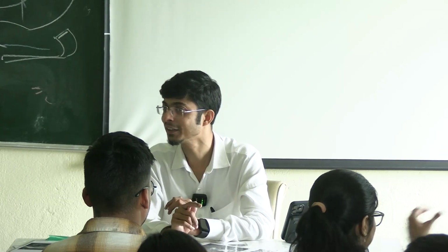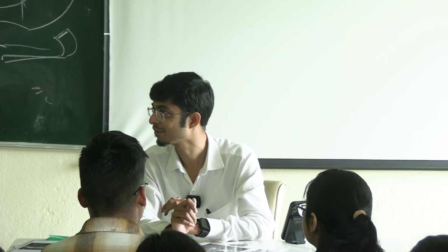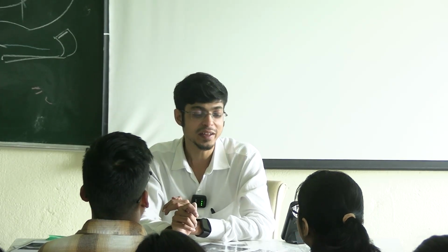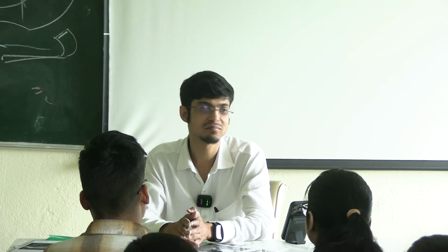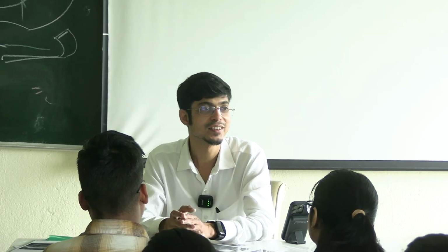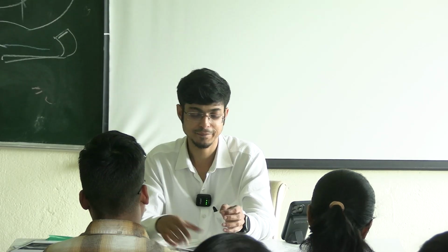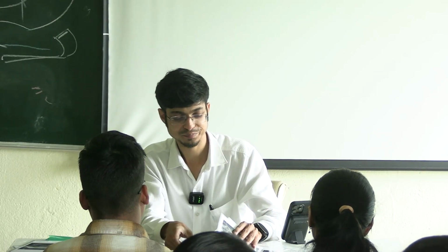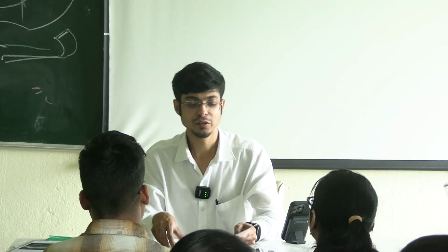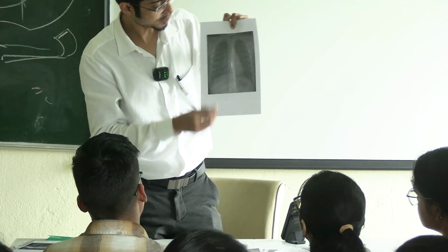First of all, that is confirmatory that the foreign body is in the airway, in the trachea or bronchus somewhere. So another thing that will tell you whether it is in the esophagus or not is this. Say not a coin, say any other foreign body. We have seen LED bulbs, we have seen everything. We don't have an X-ray of that now. So say in this X-ray, let's take this X-ray and say the foreign body is here.